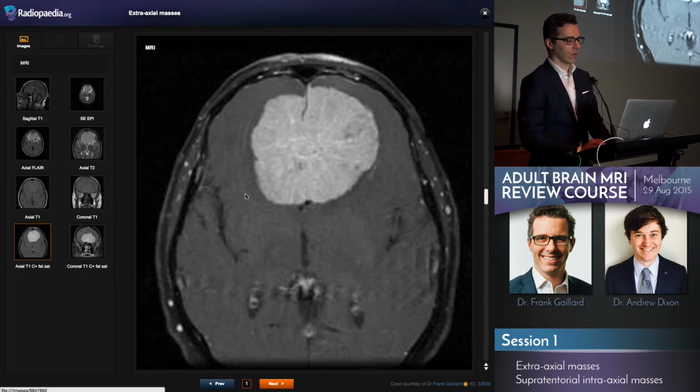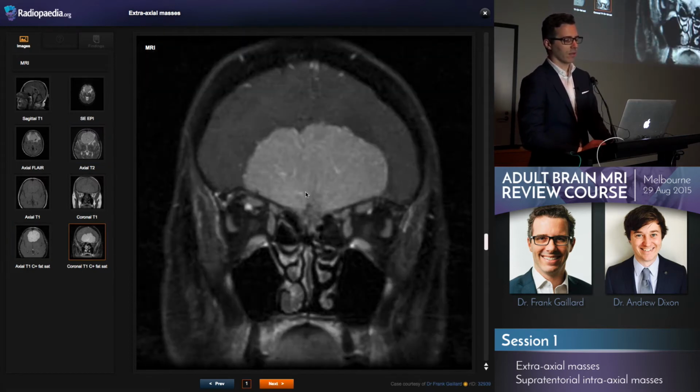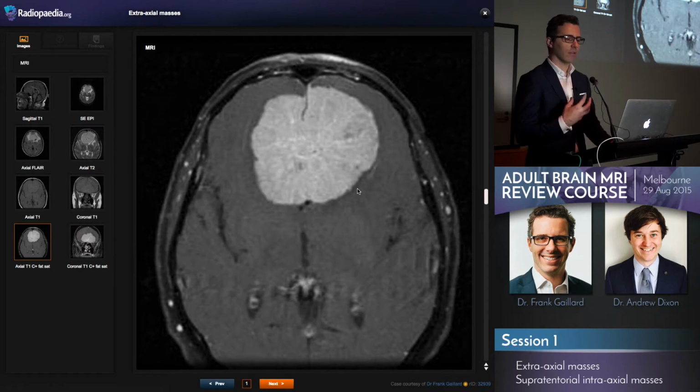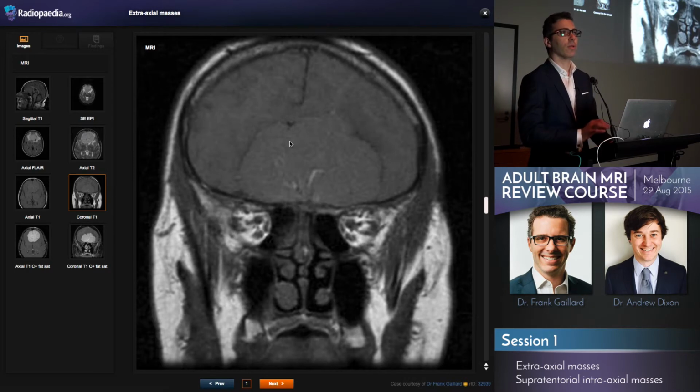Whereas in sagittal or coronal section, it'll have this sort of sunburst appearance coming up forward. And this will be the place where you see most of your hyperostosis, because that's where the tumour has been there for longest. Typically, the enhancement is very vivid, very homogeneous. The vast majority of meningiomas are just solidly enhancing very brightly without cysts or areas of non-enhancement. They usually follow grey matter on both T1 and T2.